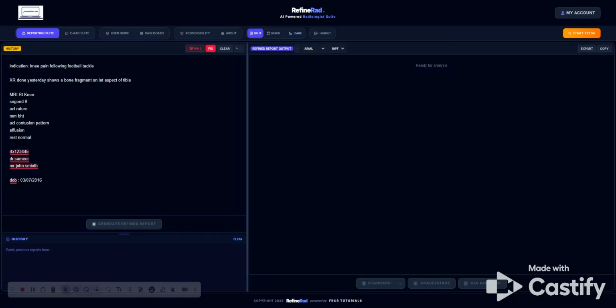It will highlight all of this in red, and you have to click fix, and then it will list all the protected information that's been picked up. This area is all working within your own local cache, so it's not going into any server. So this is safe, it has not yet left the NHS working platform.